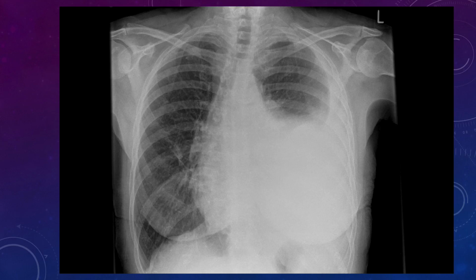This patient's probably got 3-4 litres of fluid within this pleural effusion on the left side of the chest. But the net effect is, due to the increased density, the fluid is actually pushing the mediastinum across. So you can see the trachea is deviated to the right now. The whole mediastinum is pushed over to the right. The right lung is doing its best to do all the gas exchange for the patient. We've got a tiny bit of aerated lung at the top.